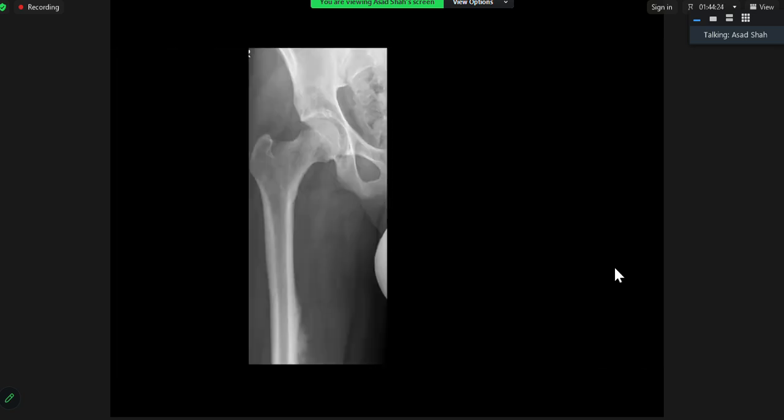What about this one? This is a 16-year-old, and he has got right thigh pain. Sir, I'm provided with the radiograph of the hip, and I could appreciate a lesion partly visualized in the shaft of the femur with significant periosteal reaction, giving a sunburst appearance and cortical thickening. However, I would like a dedicated view.